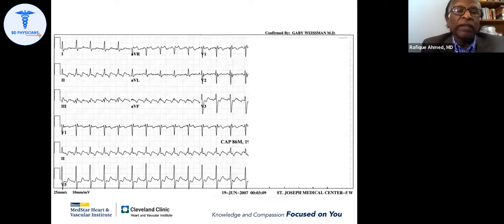So you see, if you look for it, then you will see it. So you think this is the P wave? Possibly, right? Possibly, maybe. Yeah, that's what you are thinking, right? Yes, sir. Okay. So you saw a negative P wave before the QRS complex. So it can be an atrial tachycardia. But do you see any other P wave? No, sir.